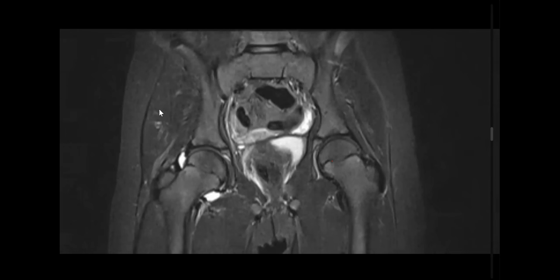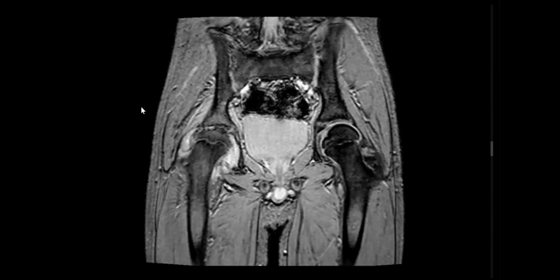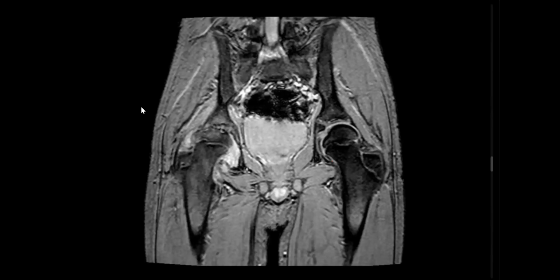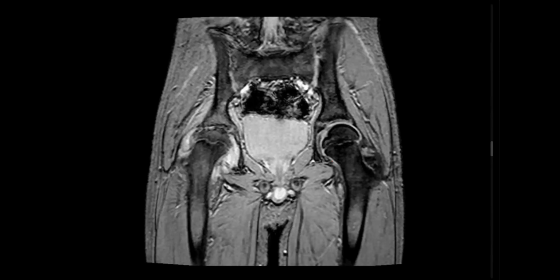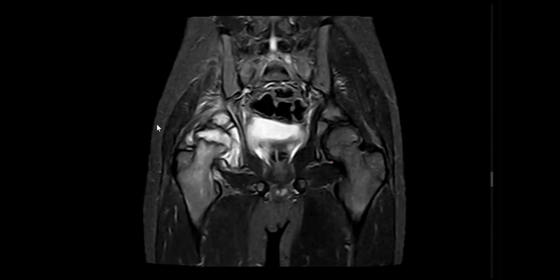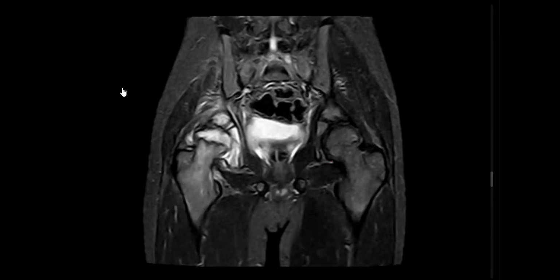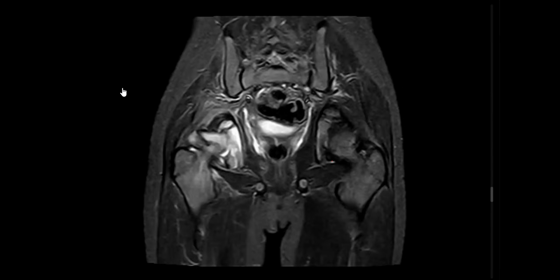Okay, I will answer after the second case. What do you think about this one? Another child with limping. I will answer both cases, my friends, but just after my friend answers. Okay, proceed, ya boss.